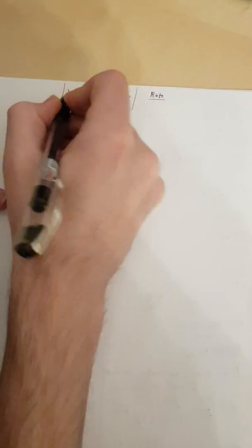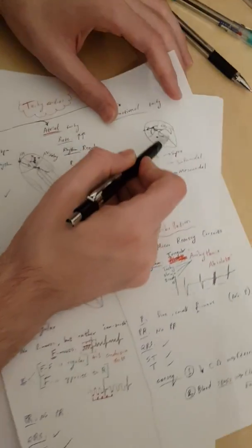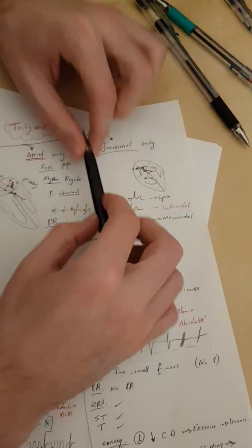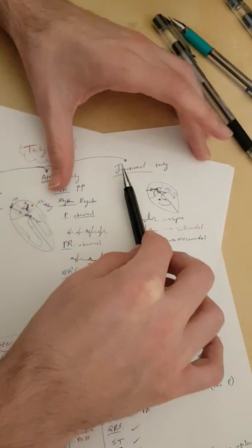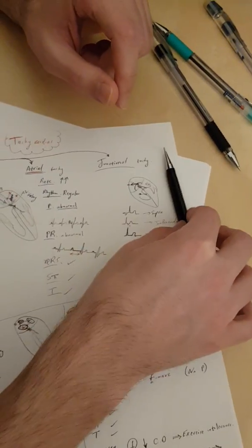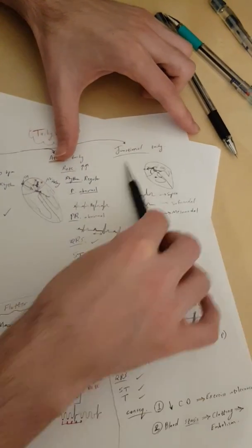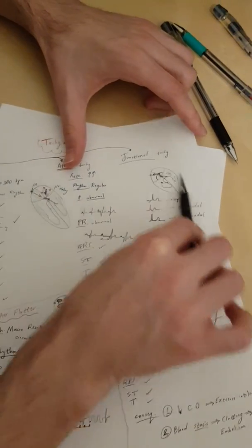how much is the rate going to be in these? By the way, let's just explain what these are. Ventricular tachycardias, it means that you have beating, but it all comes from here. You know how you might have a normal one, then a VPC, then a normal one, then a VPC, right? You can call this VPC in bigeminy because it comes normal, abnormal, normal, abnormal, and so on. Or if you have two VPCs, you call this a couplet, right? Or if you have three VPCs, then you can call it a triplet.